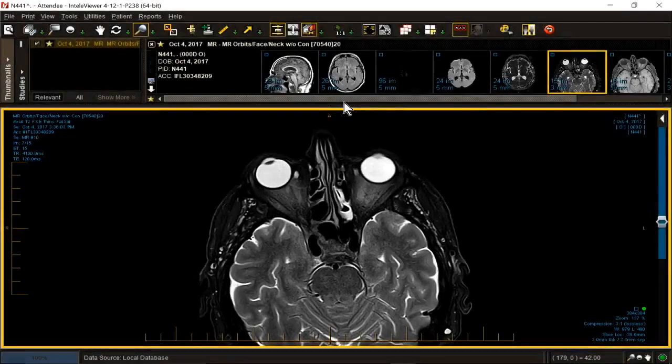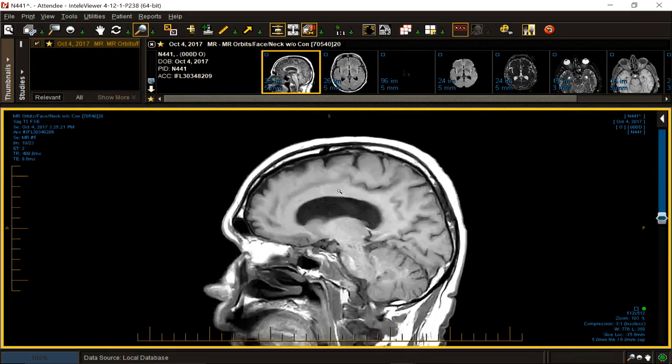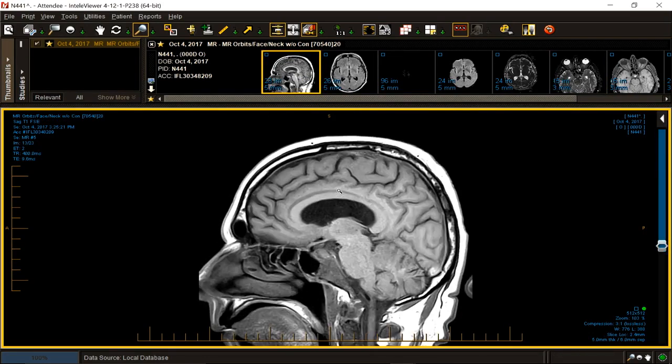It's a quick one, just a comparison. As many of you requested, want to see more than one example of each? Hint, hint, you've seen something like this before. While you're looking, I am going to scroll the whole case.